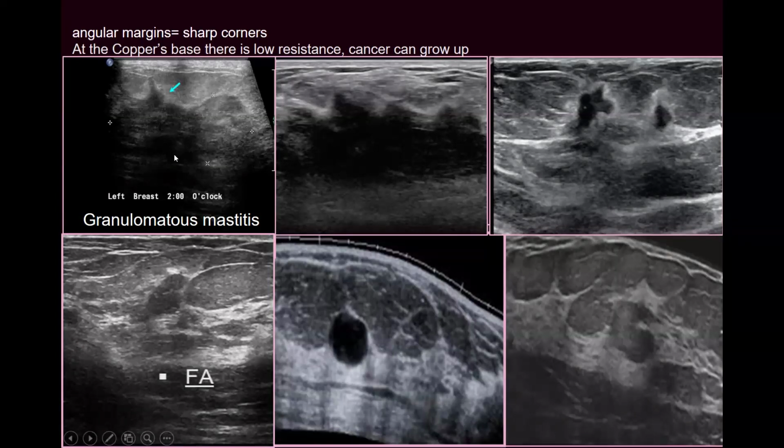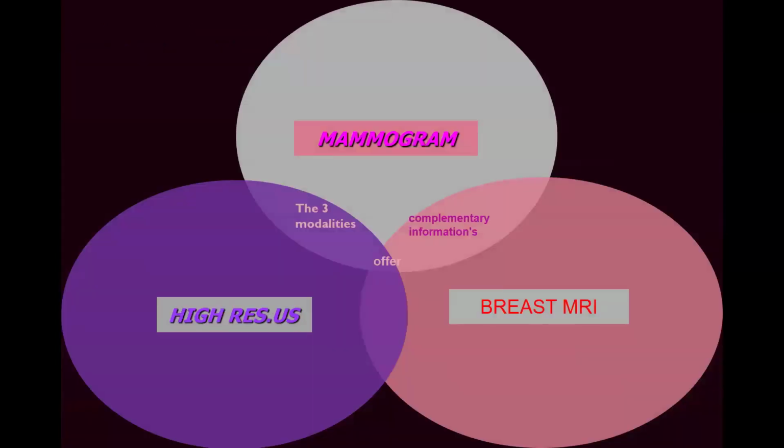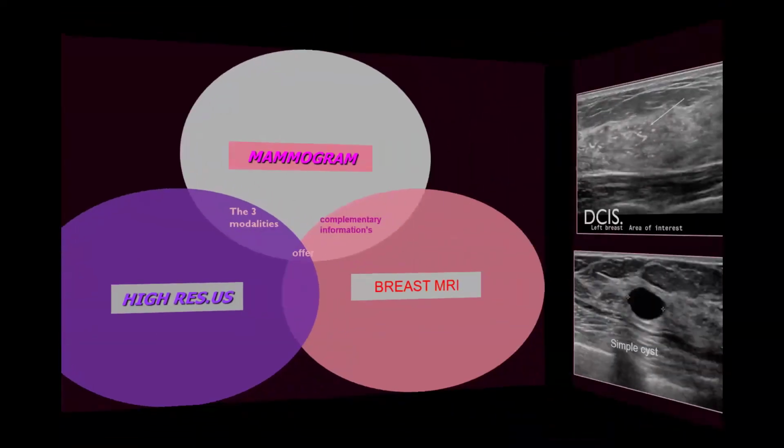However, in the case of this granulomatous mastitis, it is really difficult apart from the clinical picture, and we probably might need to go for biopsy and pathological diagnosis.